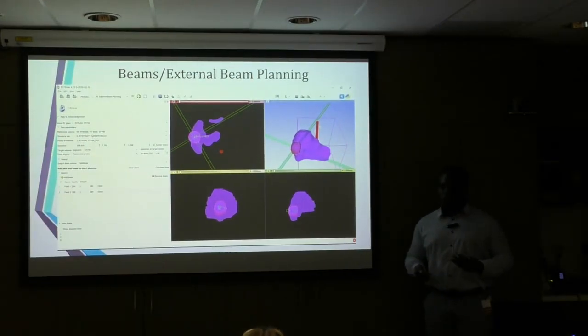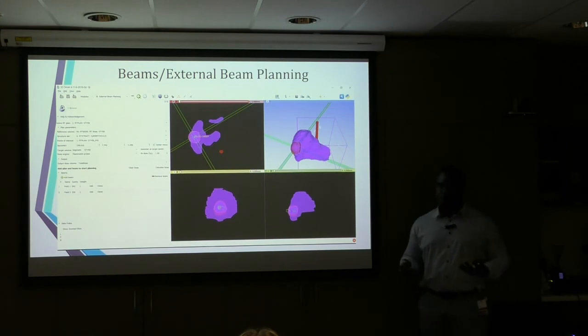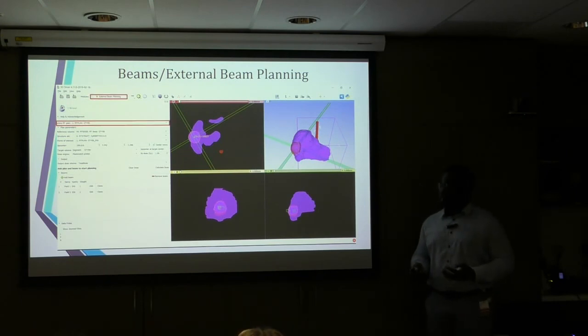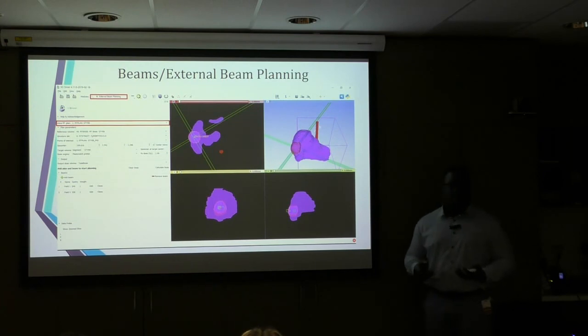And you can also use it to load up treatment plans that you've already created and perform some modifications, such as changing the beam angles or adding more beams to it. For my project, I desire to use Slicer, this particular module, to perform a kind of robust evaluation of proton and CyberKnife treatment plans.